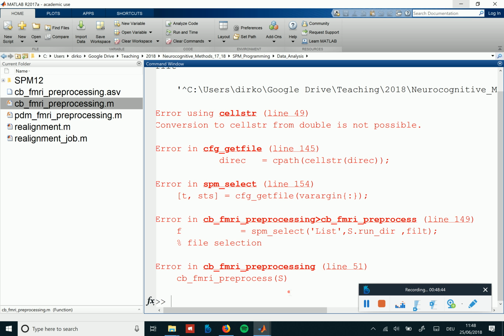Okay, so this is really nitty gritty stuff, it's just specifying the list of files that then gets entered into the SPM job structure. Because I'm now getting hungry and concentration goes down, I will figure that out. It takes like 5 minutes over the week, and then you have it, but we will come back to that because we need it again and again, because you always need to select the files that you want to do the next step with.